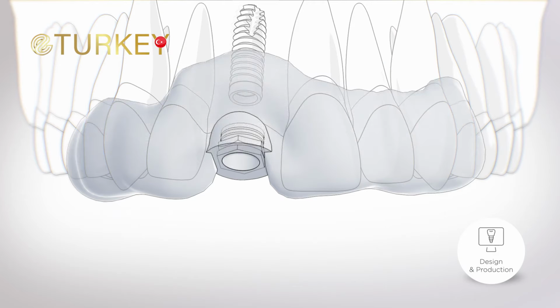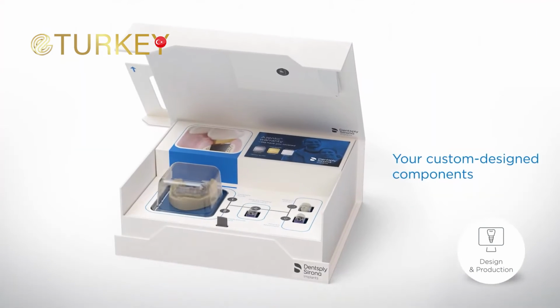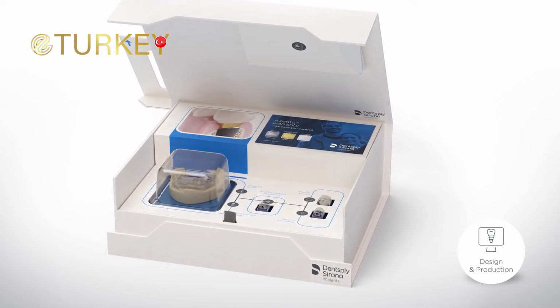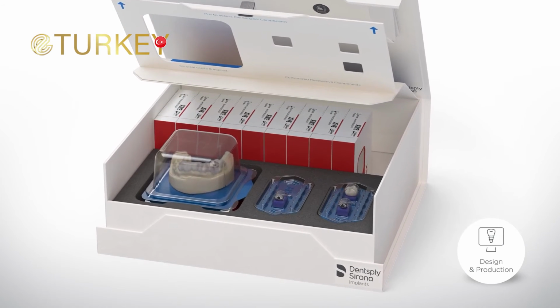The surgical guide is designed to fit over your teeth so the implant can be placed into the exact planned position. All of the customized components required for an accurate and safe treatment are produced and arranged in your personal Azento box in preparation for your 3rd step.